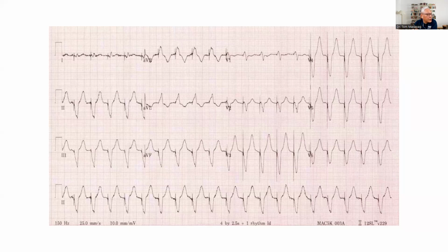All right, what is in front of you is a 12-lead ECG, and the question is, what is significant in this 12-lead? And we're going to share the results. This is how you answered. Some of you answered ventricular tachycardia. Some of you answered normal sinus rhythm with left bundle branch block. And some of you answered a ventricular pace rhythm. So let's go ahead and discuss what the answer is. Well, this happens to be a ventricular pace rhythm.